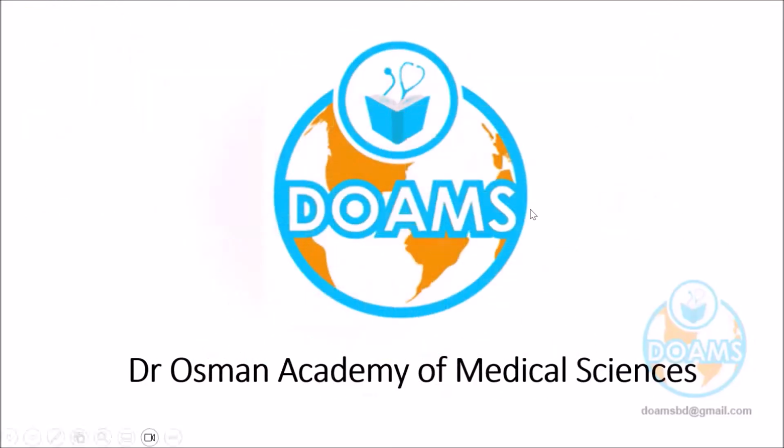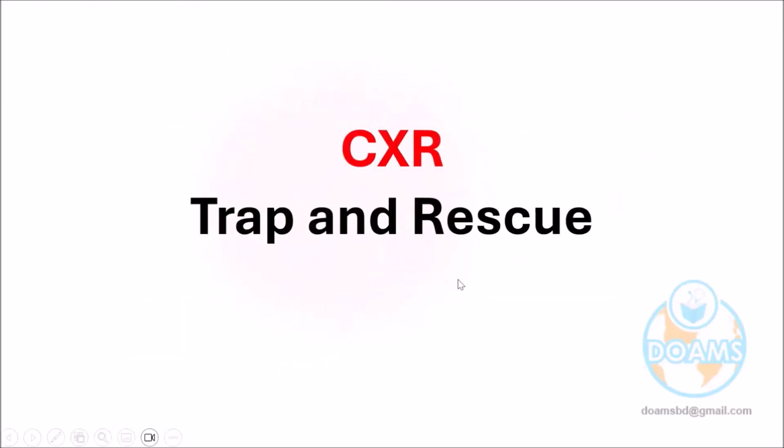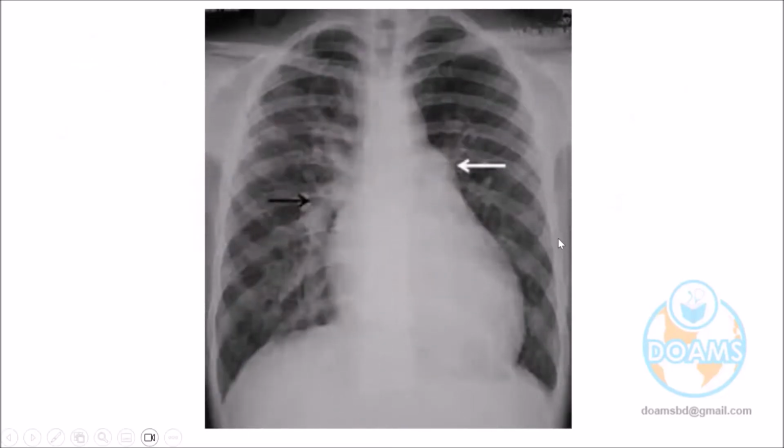Okay. So again, we are coming to the similar trap and rescue issue. Trap and rescue in the chest X-ray, very common X-ray in your AKT exam, even in the OSCE. So trap one for you now. Try to be safe from the trap.